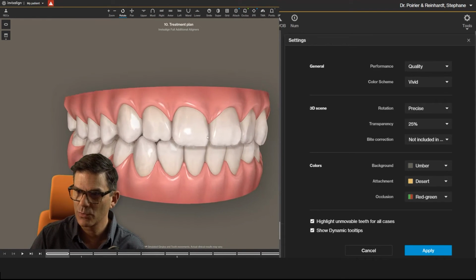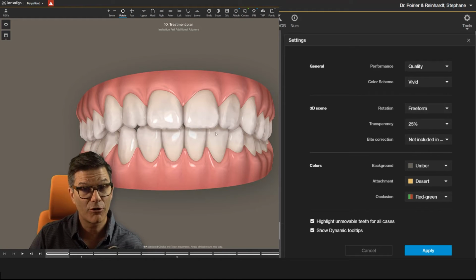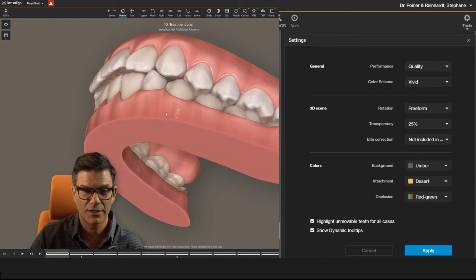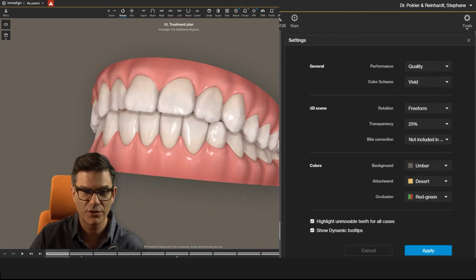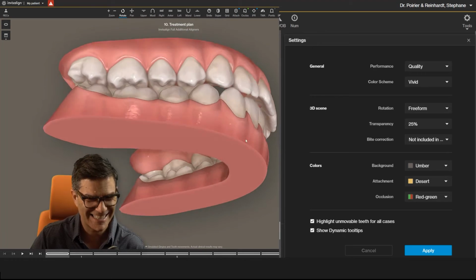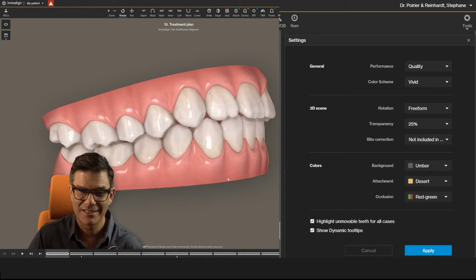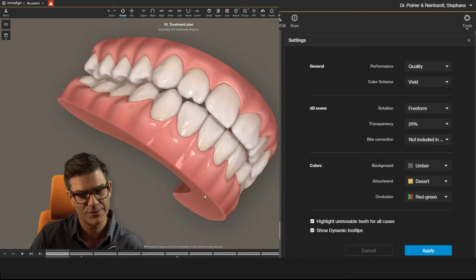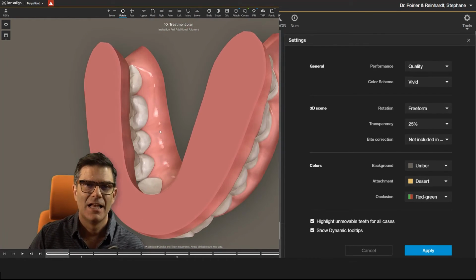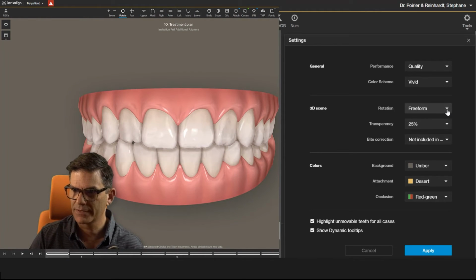You see what happens when we go with the free form. Free form, it says it's free form. You know, this is for young adults. So I'm trying to come back to where I was, but see, I mean, you want to get me crazy? You put me on free form. Let's go back like this. Thank you very much. Perfect.